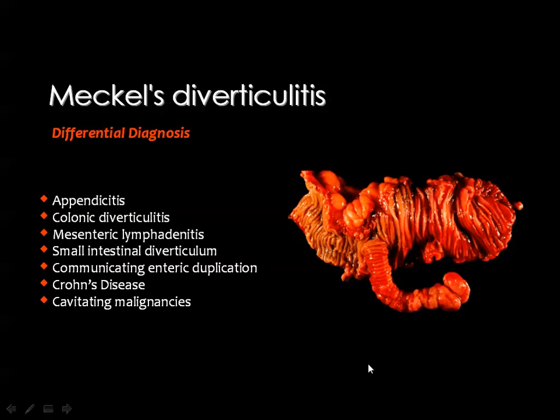Then these are the most common situations mistaken for, or that can produce symptoms similar to, Meckel's diverticulum, especially when it is inflamed, Meckel's diverticulitis.